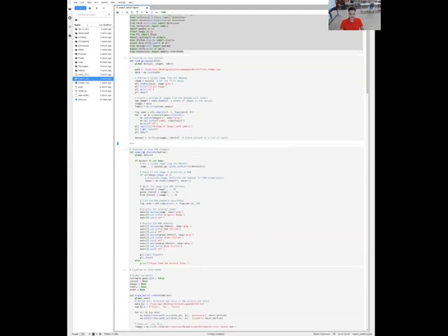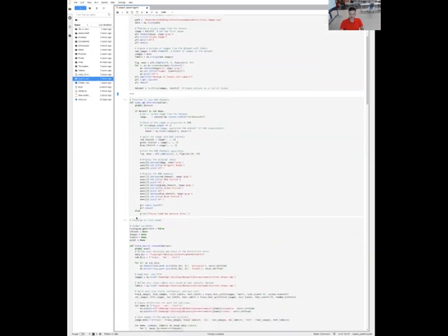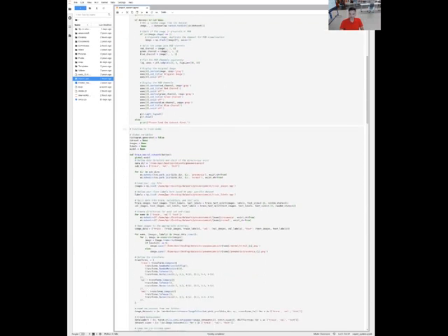And here we can see the function to view the RGB channel and the train model. This is the most important function here. We actually train the model, and by training this model, we can get the result. We reach the conclusion of whether the given chest X-ray is pneumonia positive or negative.